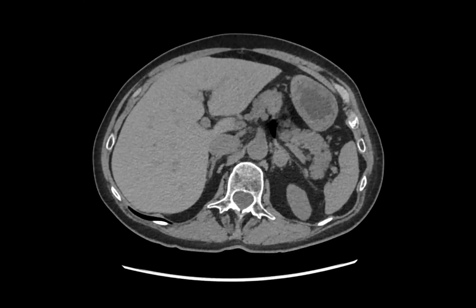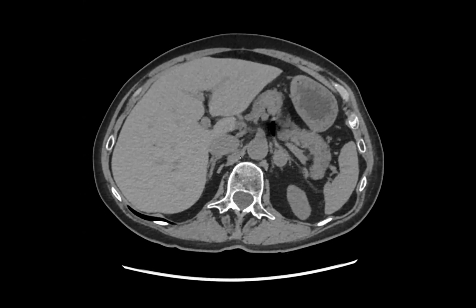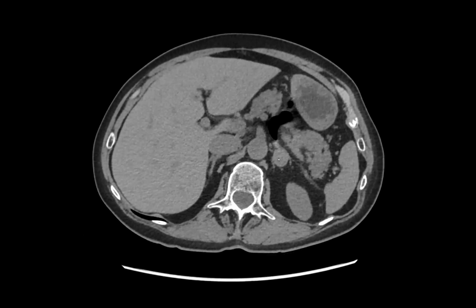This is a patient with history of adrenal lesion. Here it is. On non-contrast, it measured almost 50 Hounsfield units, 54. So it's supposedly, I think, above 40 on non-con, you should be really concerned that it's definitely not an adenoma.